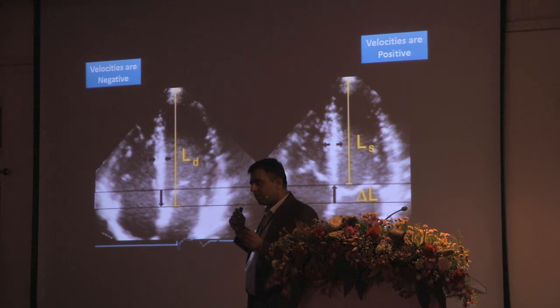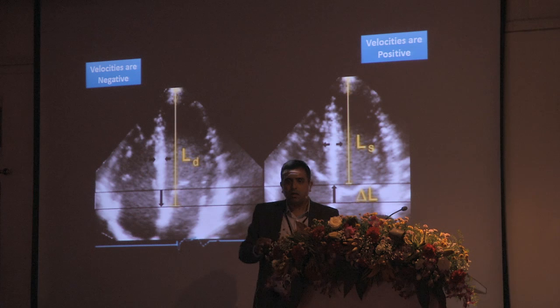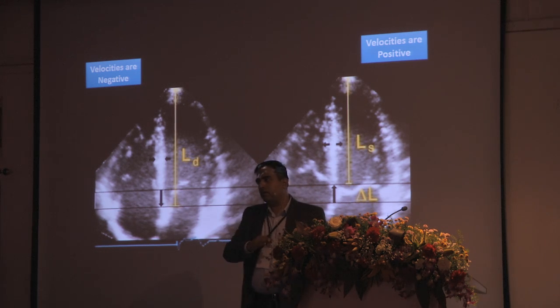So this is point number 5 that I would like you to remember: the contraction happens base to apex and back. The apex is entirely fixed. It is the base that moves up and down.